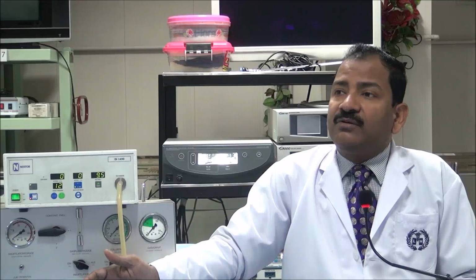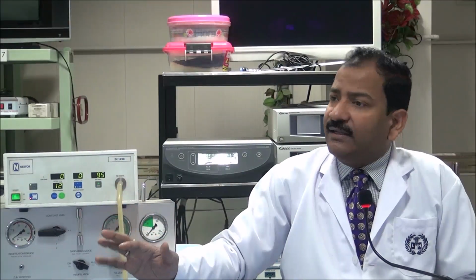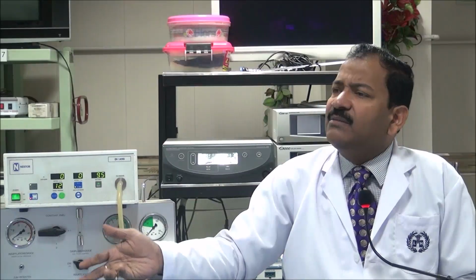So it is our job that if the CO2 vendor is giving you the CO2, you must try to check whether it is medical grade CO2 or industrial CO2. Once you ask them for CO2, they think it is something not life-saving. It is not oxygen. CO2 may be for some other purpose. So they give industrial CO2.